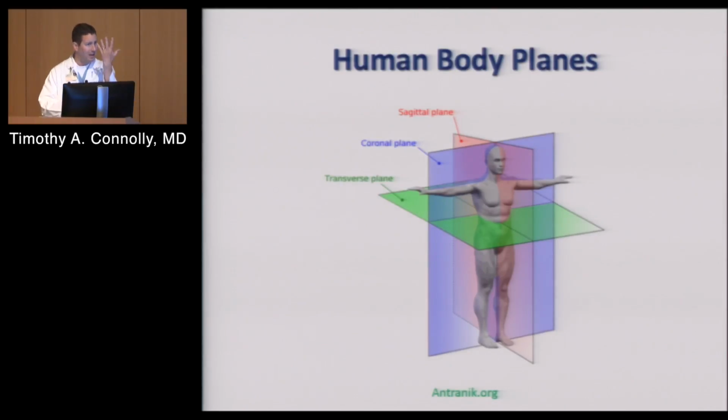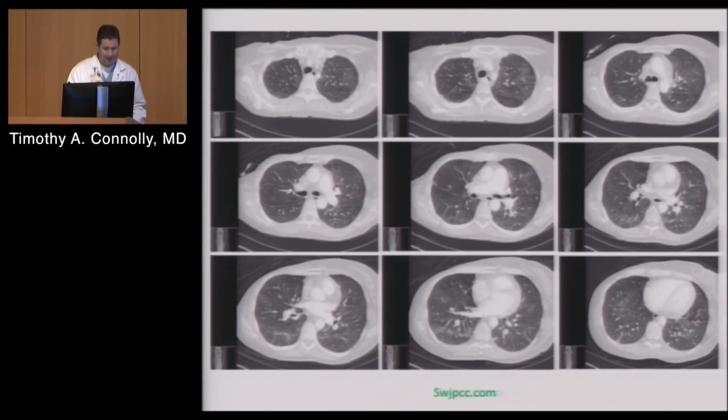But this is really, when I look at anatomy, how I visualize it in today's world. So this is going to be a basic view of the lung, and then it's oriented this way for you. As I always point out to people, when you're getting your orientation, we're looking from the patient's feet up through their body towards their head. This is the front of their body, back of their body, right side, left side.